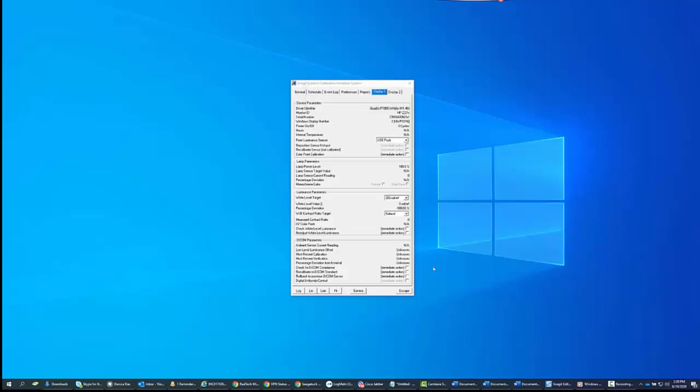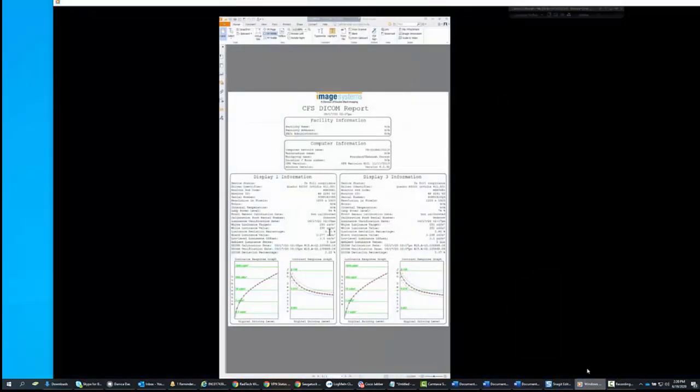All right, so one of the messages you will see when you initiate the calibration is this: the USB chroma sensor is not responding. This is indicating that the puck is either not properly connected or not connected at all. If a puck is connected but the cover is not open, you will see a message like this.